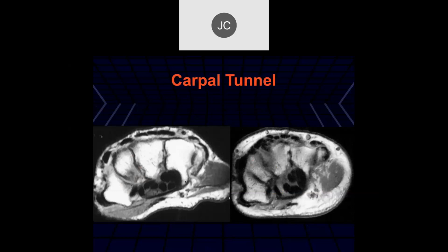Okay, so this is kind of what the flexor retinaculum looks like. It goes between the hook of the hamate and volarly across the wrist here with the flexor tendons deep to the retinaculum. It should be relatively flat, like we're seeing here. We should have little separation between the flexor tendons.